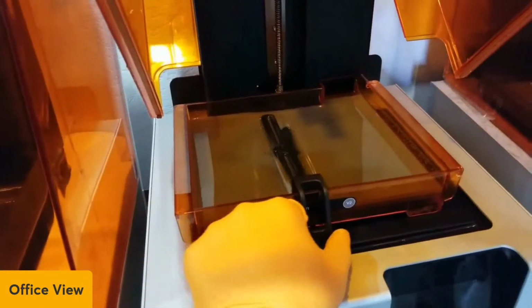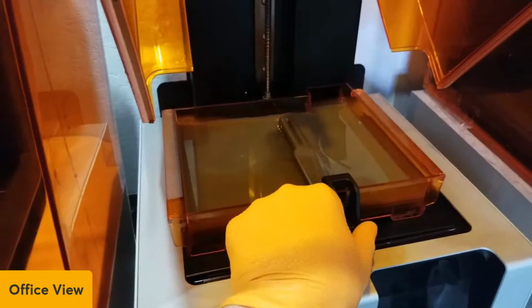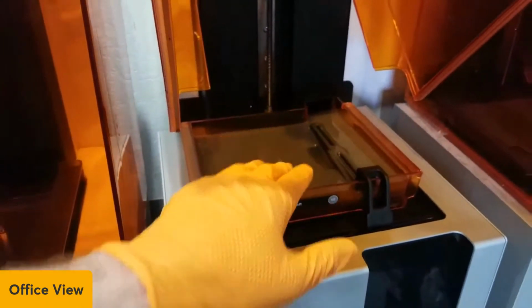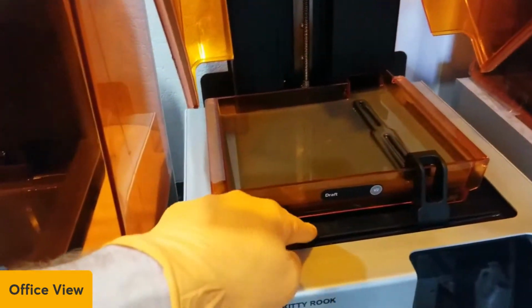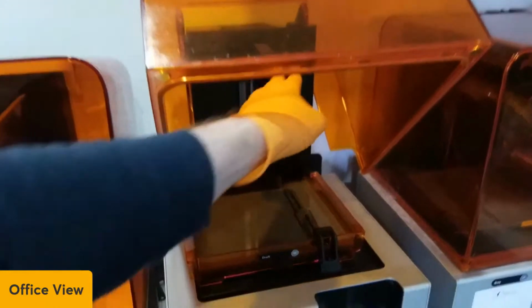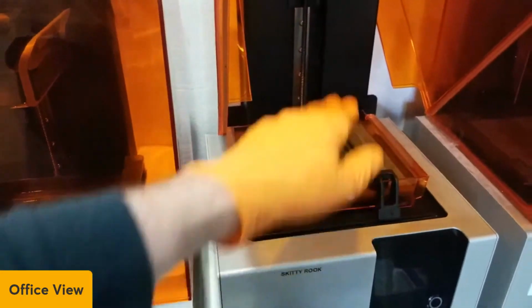As you know, some of the resins we use in 3D printing have pigments and stuff, and they just need to be mixed. So this keeps it mixed, keeps the properties right. And this plate right here warms up, so it's got to be up to a certain temperature. So this is kind of an all-in-one package. It dispenses its own resin as it needs it, this keeps the resin mixed, and it does all the printing.